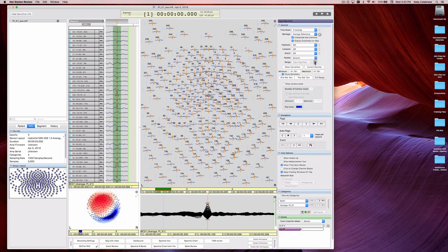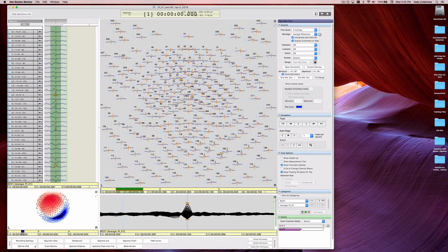Look at plot and map to get an idea of the location and orientation of the source or sources that may be contributing to the scalp topography. The dipolar activation has a positive and negative field projection on the scalp. The source would be located in the neutral gradient somewhere in between.